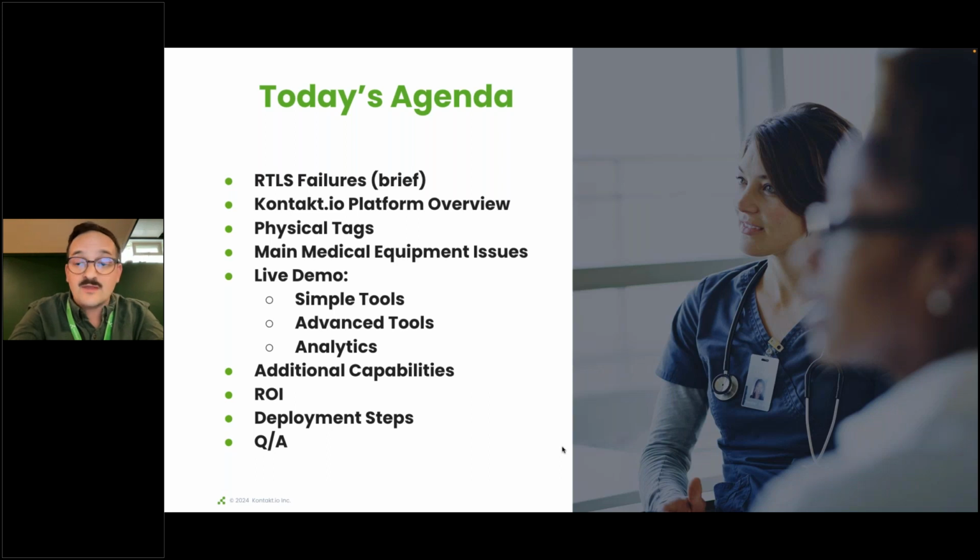Then we'll look at the physical tags themselves that we can affix to different types of medical equipment. Talk briefly about common equipment management issues. And then that will be the kickstart into the most exciting piece, which is a live demonstration of what our platform is capable of and how you can go from solving very simple tasks to incredibly complex ones, from our simple to advanced tools, and then also what kind of analytics we've got. I have a sneak peek too of some additional capabilities.